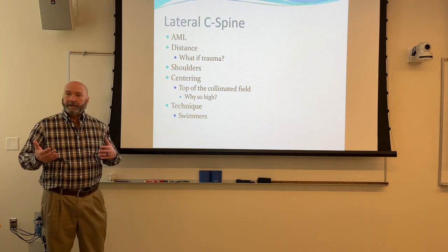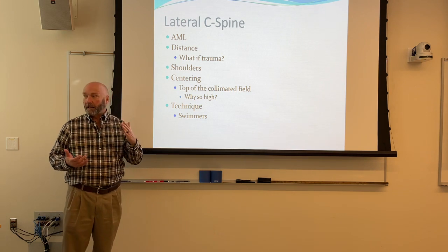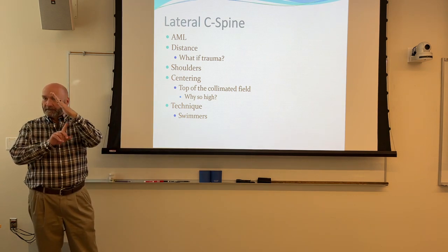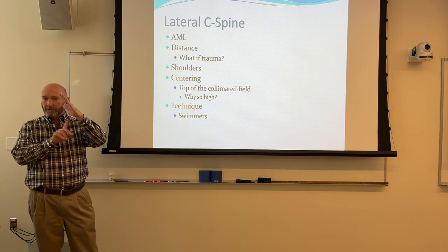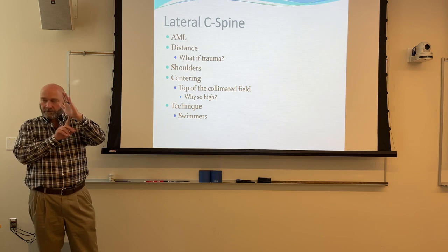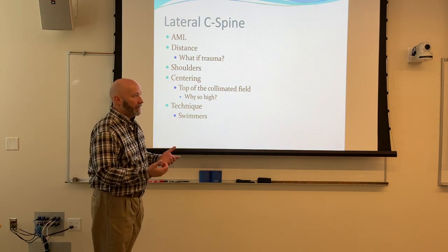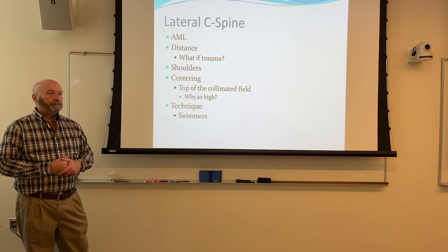And what's going to happen is that the line that runs down the backside of the sella turcica is what we call the clivus. Remember the clivus, right? The clivus should point to the dens. All right, it should point right to the tip of the dens. So if you've got misalignment of those two things, essentially the dens is too far posterior, it's not in the right place. Okay, so it's a clinical indication the patient has a broken neck. You're going to go to CT for sure now.